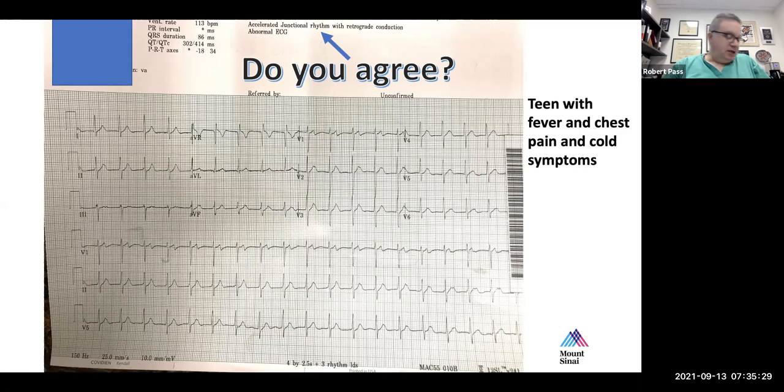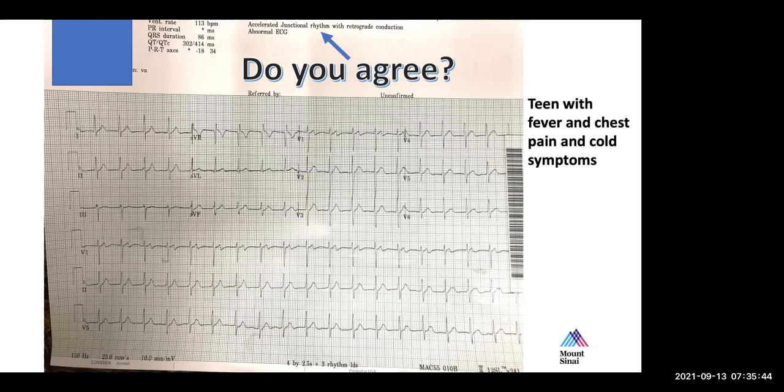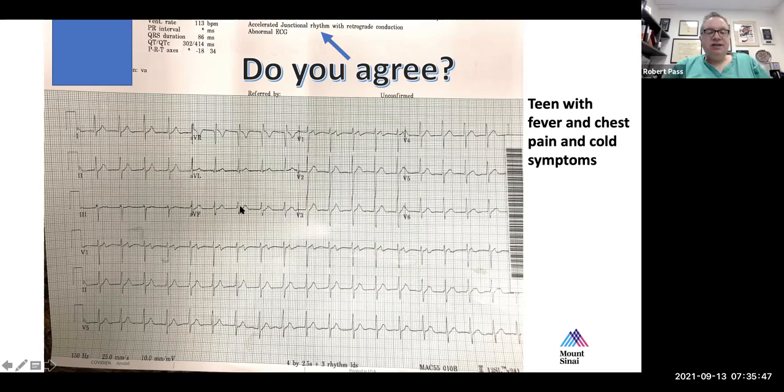So it also could be VT, right? We just said that we have an accelerated ventricular rate. So this could be VT because we don't really know what the patient's QRS looked like before they were in this rhythm. And in fact, the QRS axis is a little abnormal.